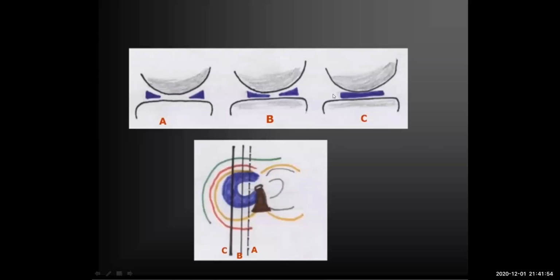It is normal to find one fibrocartilage piece in one or two slices maximum, but not more than three. Then it starts the proper cut to show you the anterior and the posterior horn. The shape of the meniscus should be like a triangle of pizza, a very nicely laid triangle with all the sides of the triangle completed, and it is contained.